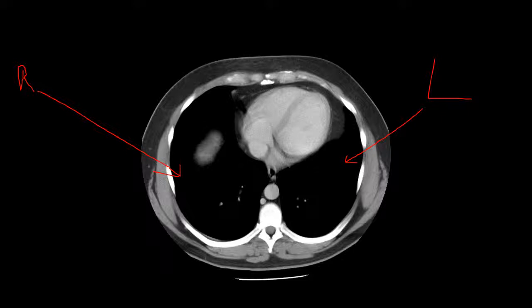How do I know that it's the very top of that scan? What do I see on the screen? I see a heart and I see lungs, all this black. Air shows up as black on normal X-ray and CT. So that's air, which means that this is at the bottom of the lungs because the base of the heart is here. A couple other things to note is that this CT scan has IV contrast.